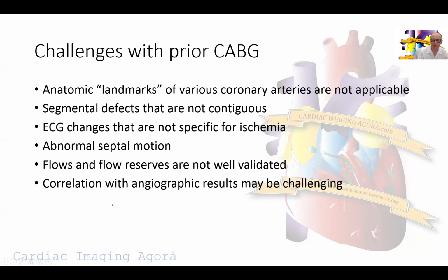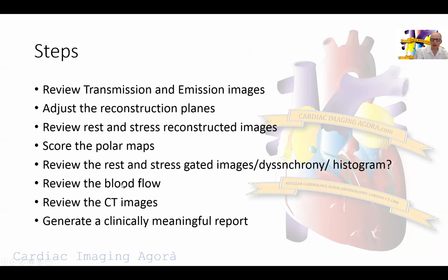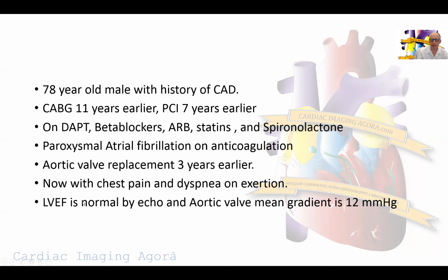Again, we go back to our laundry list of steps we follow in reading these images. Today is going to be a PET scan, so therefore we go with the transmission and emission images first, and we follow all these steps till we generate a clinically meaningful report.